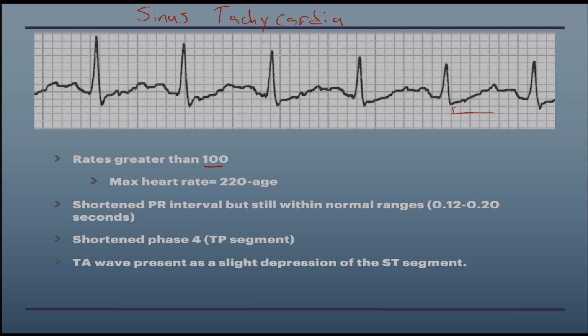this is our T wave right here. This is our T wave, and then this little hump right here is our P wave. So we got a T wave and a P wave. And if we look at this, it looks like the P wave is actually superimposed into the T wave preceding it, and it almost looks like a camel hump.